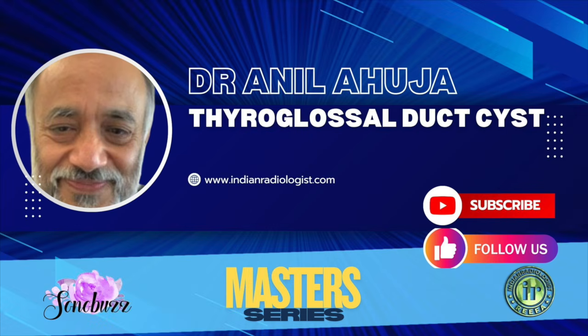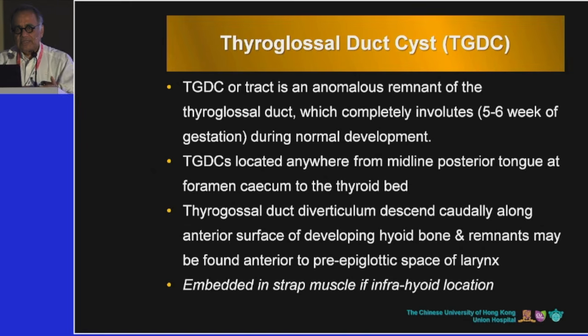Now let's have a look at thyroglossal duct cysts, because these are very common. Most of them are infrahyoid. More than 60%, 70% are infrahyoid. Then is at the hyoid bone and few suprahyoid. So remember, it is embedded in the strap muscle if it is infrahyoid. So most thyroglossal duct cysts will be embedded within the strap muscle, and that is your simple clue.